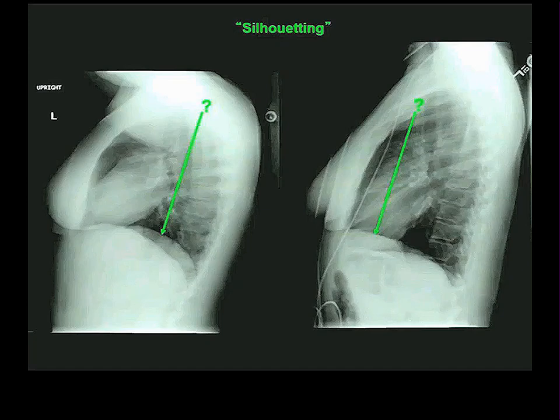Now, this thing here that I've drawn arrows to is part of the diaphragm. You haven't dissected the diaphragm, but you must know what the diaphragm is by now. I mean, it's what the heart sits on. And the reason I can see the upper surface of the diaphragm is because it silhouettes against the air density lung. The diaphragm is routinely said to have a left half and a right half. They're innervated separately. The left half is called the left hemidiaphragm. The right half is called the right hemidiaphragm.